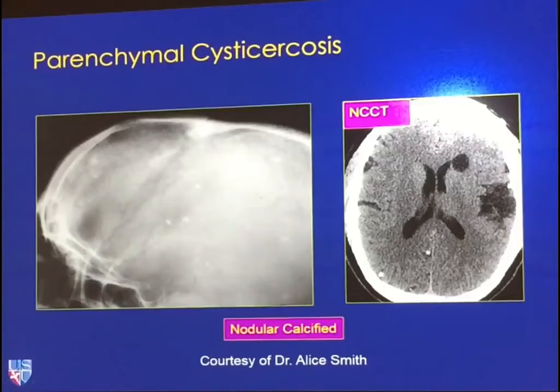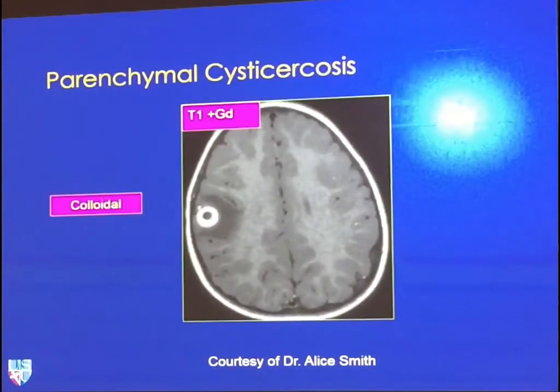Can I ask you a quick question, sir? Yes. If you go back to that previous image, the brain enhancing lesion, we saw that in toxoplasmosis too, and the differential for that was lymphoma. How do you distinguish between the two?